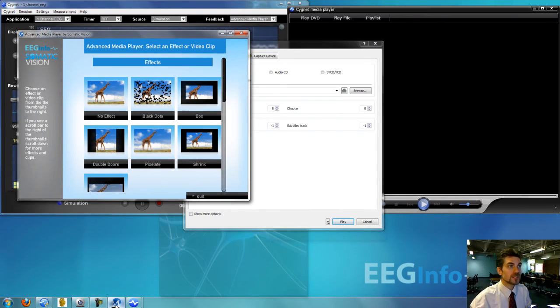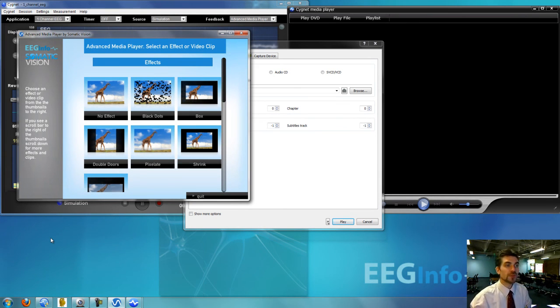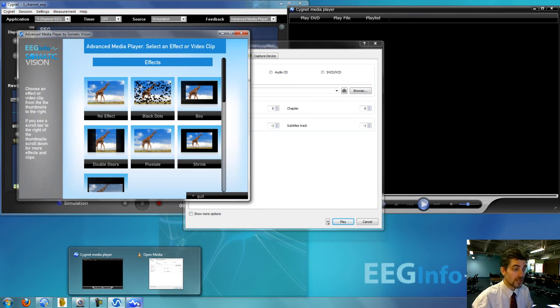And again, here is the media selection window. So I have all of those available down here in my taskbar. So that's an important piece. Some people have gotten hung up finding all of those windows. So just remember to come down here into the taskbar. In the later operating systems, the more recent operating systems, you can just hover over and it'll show you what's underneath those. And then you select those.